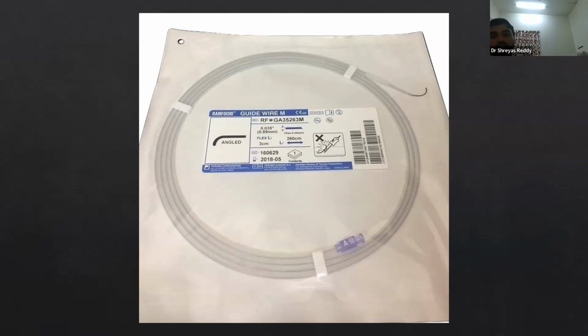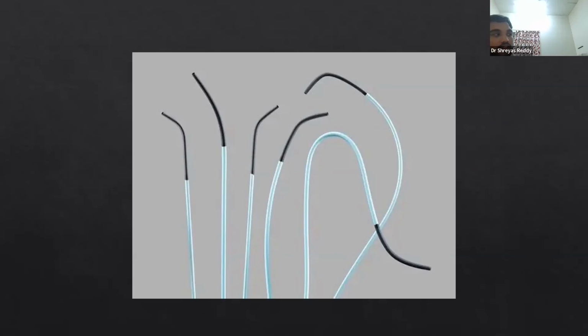So okay, identify what is the structure. These are catheters. Yeah, these are vascular catheters, angiographic catheters. Can you name a few angiographic catheters that you have come across? Like if we have seen a Simmons 1 catheter. There is a basic most one that you use. Vertebral catheter. Yeah, vertebral or Cobra. Yeah, Cobra catheter. And Judkins left. Yeah, those are cardiology specialty catheters. Okay, so these are angiographic catheters to cannulate the vessel and inject contrast inside the vessel to look specifically what is the disease status.